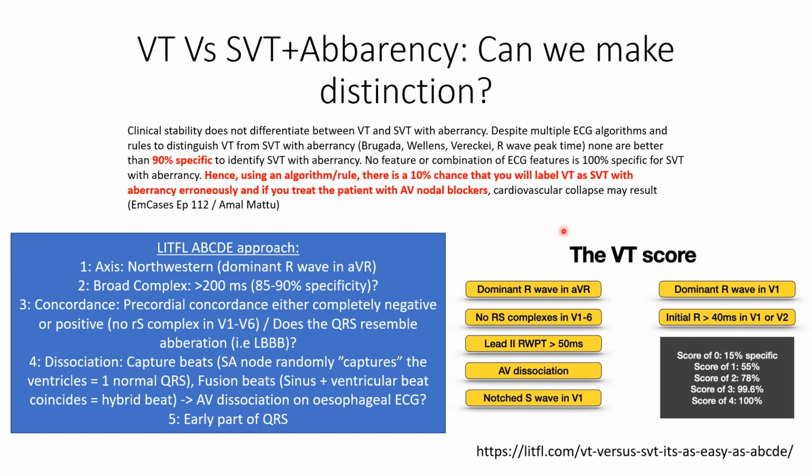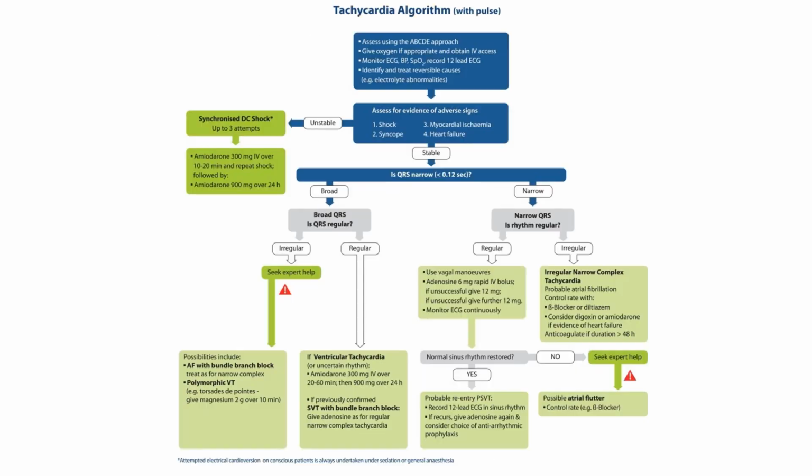There's even a score for this where a lot of these go into, and if they have more than 3 points, it's quite specific. So there's some controversy here between the different blocks, and you'll see that there's also some controversy between the different guidelines, as we'll show now.